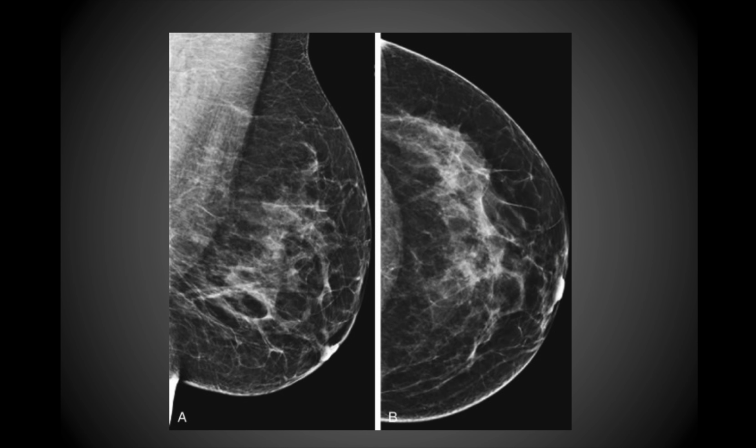This is a normal mammogram, and so if you saw anything, then you would progress to either do an ultrasound and or additional, more targeted x-rays of the breast. You can also do MRI of the breast, though that is somewhat less common, unless there's a history of breast cancer.